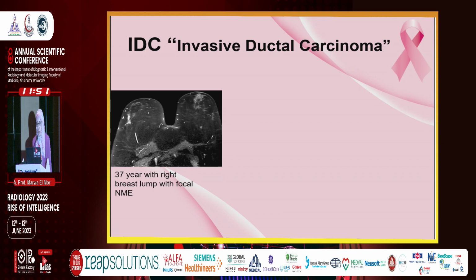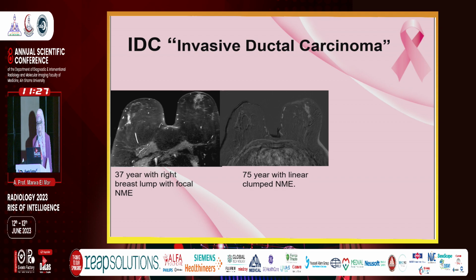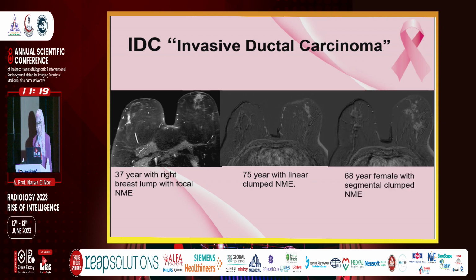Invasive ductal carcinoma also can present as non-mass enhancement. This case presented to our department in the MRI unit. We can see here a focal area of clumped enhancement in a 37-year-old presented with a right breast lump. On biopsy this was found to be invasive ductal carcinoma. Another patient presented with linear clumped enhancement along the ductal distribution and was found also on biopsy to be invasive ductal carcinoma.